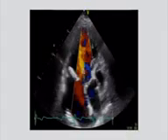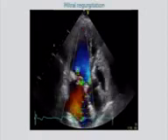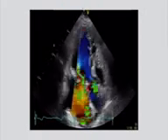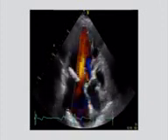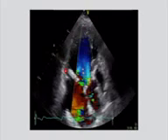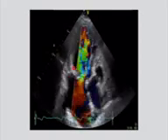And here we have a concomitant problem, mitral regurgitation. You see that there is aortic stenosis here, the valve is calcified, and in addition, it is a regurgitant jet. Why? Because the patient has concomitant mitral annular calcification. Again, patients with aortic stenosis are frequently very old, and therefore they have multiple problems.